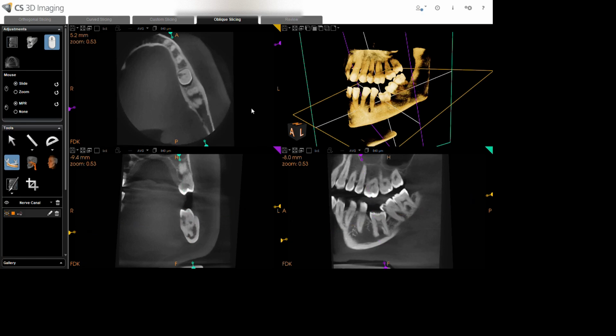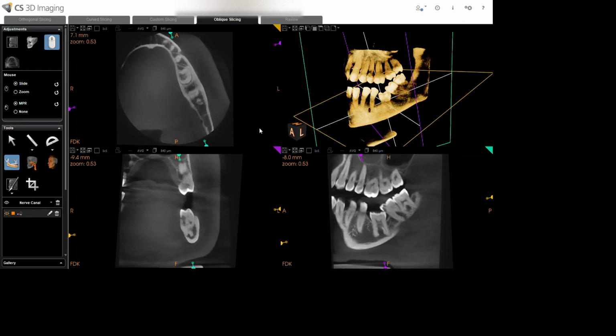Now as we move further, what is happening? The resorption is extending along the lingual aspect of the pulp chamber as well as here. So you can say that there is cervical external resorption involving the radicular dentine, and moreover it is extending along both sides, communicating with the lingual as well as the buccal aspect of the pulp chamber. This resorption is communicating on both sides.